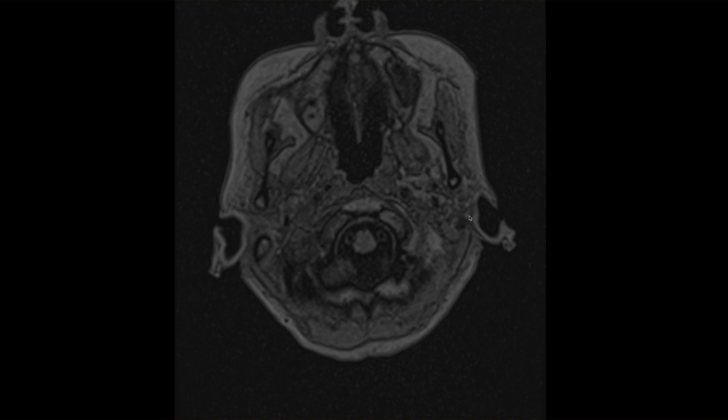So the first thing I want to go over, though, is a couple of acquisition parameters, acquisition types that are probably relevant for you as someone doing research. The first thing is really how these images are encoded, in broad strokes.